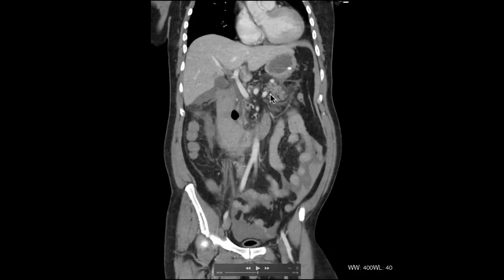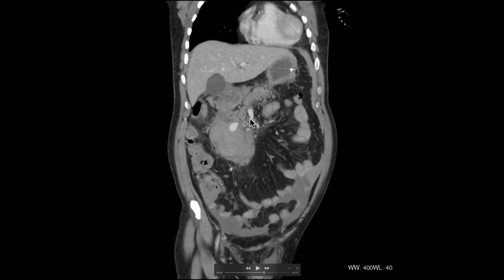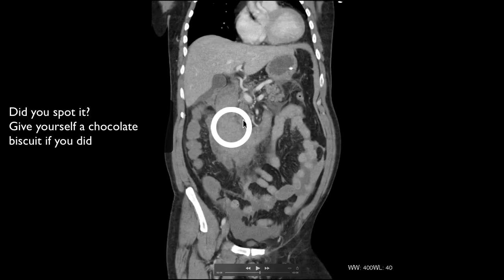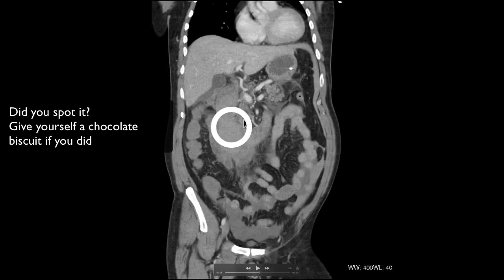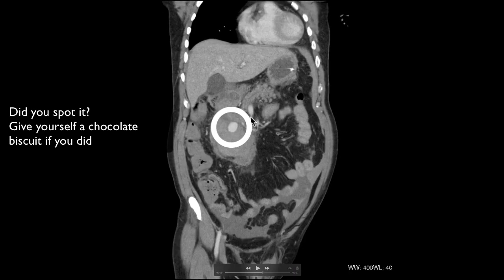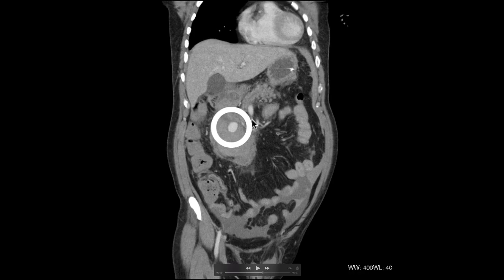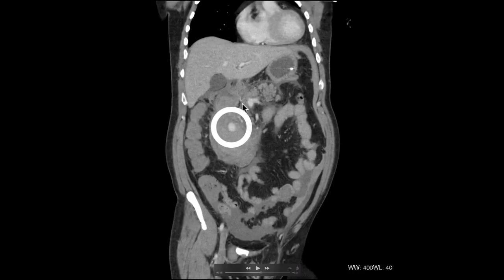This patient's got another vascular complication though that you sometimes see with pancreatitis, and that's a pseudoaneurysm. A pseudoaneurysm is basically when you have a defect in the wall of an artery and you have a contained leak effectively. That happens in pancreatitis because you get all the nasty pancreatic enzymes released, and they bathe the vessels, and there are lots of blood vessels around the pancreas. There's a rich blood supply coming from the SMA and the celiac axis.